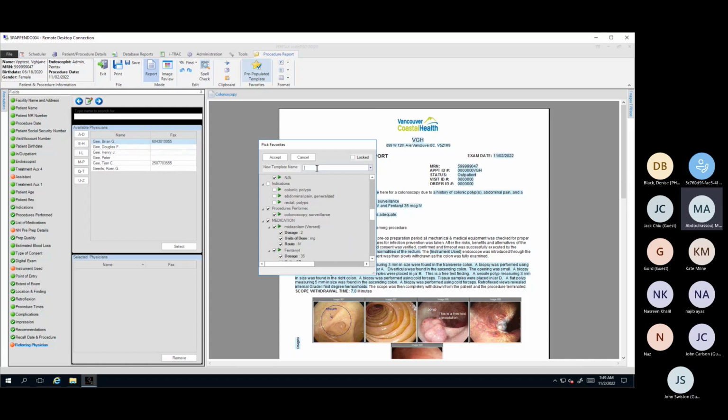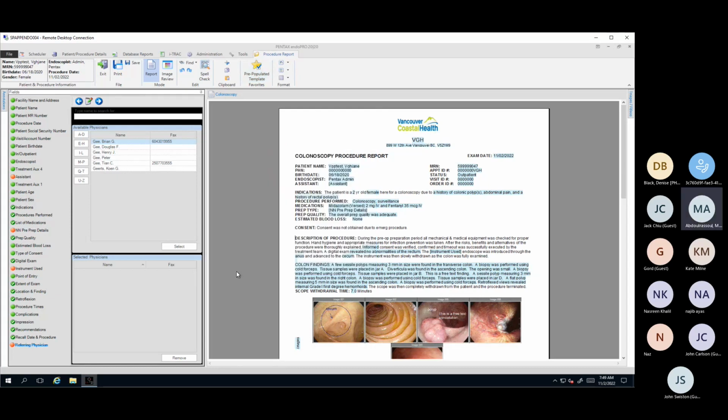Then I'm going to give my favorite a name. For my case, I'm going to call this, let's say, train session. Okay, and I'm going to accept that. And that saved my favorite there for me. So that's said and done, and I'm going to show you how to open that favorite in just a minute.